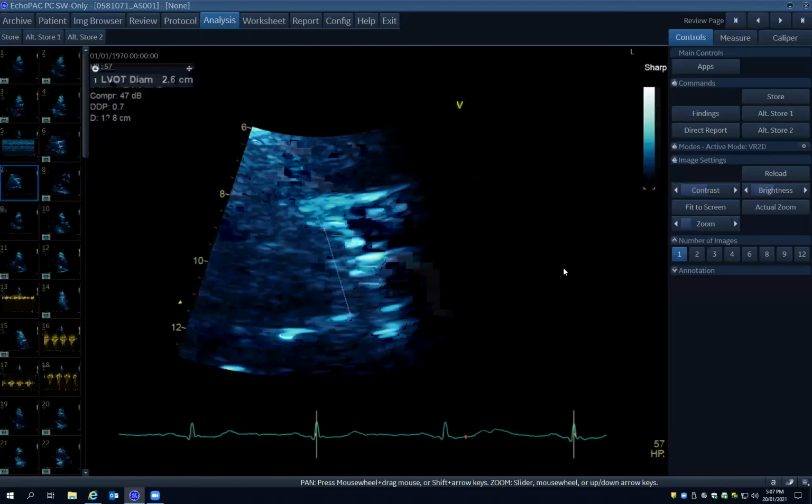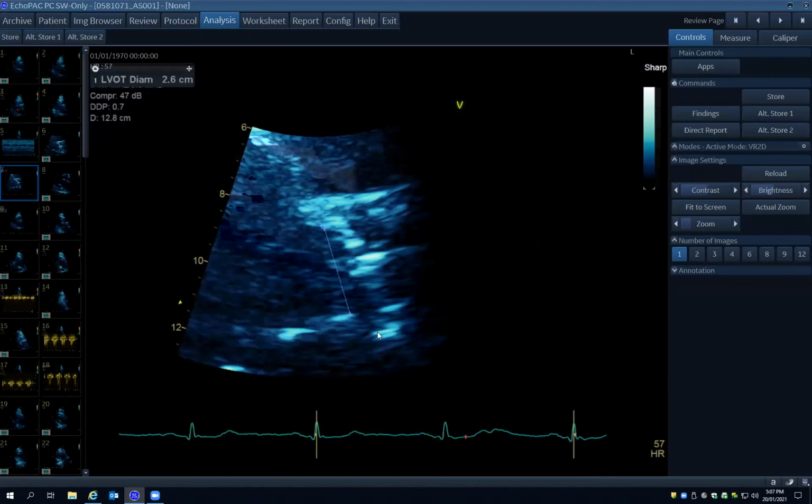Yeah, so this is what they came up with. Can you, again, just give me a critical analysis of this image? Look, I think it's reasonable given the degree of calcification around here. A couple of things with this. I think you have dropout around this region here, which may be underestimating it. But as a rule, I tend to say 1.6 to 2.4 are reasonable LVOT diameters. If you are beyond those boundary conditions, you have to look at a patient.